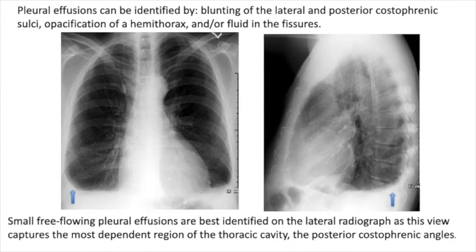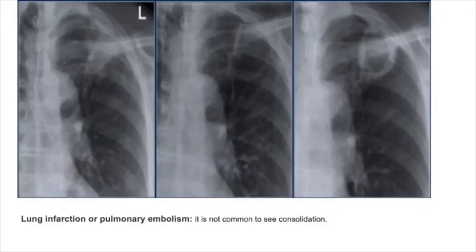This is a sample of small pleural effusion. You can see in both costophrenic angles are not visible. Otherwise, when you are suspecting a pleural effusion and the costophrenic angle looks clear, you can request a lateral chest X-ray, depending on the side, right or left. Remember, the posterior costophrenic angle is lower than the anterior one.